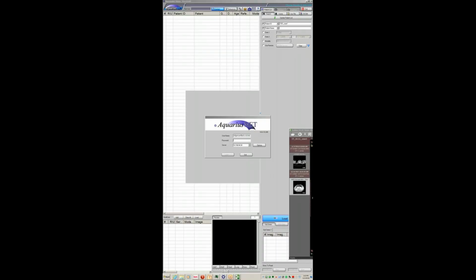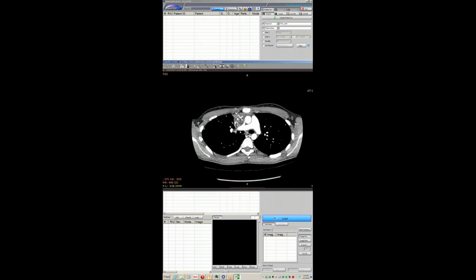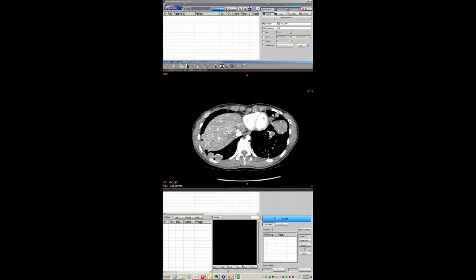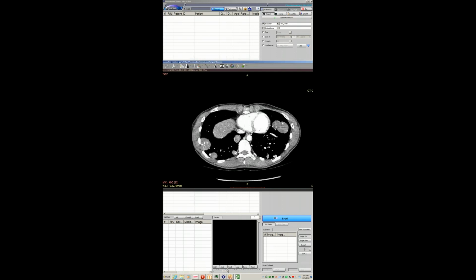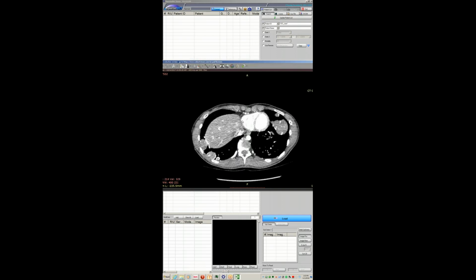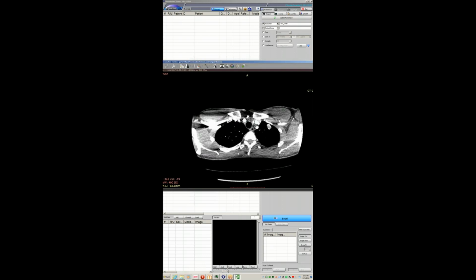So this is that case I think I showed. Maybe I never sent it. I don't know. Sometimes I don't send my cases. He had this germ cell tumor, mixed teratoma, yolk sac tumor, some mixed tumor that was treated, and he had all these mets that were treated, and the malignant portion was killed, but the benign teratoma portion has remained. And the problem is that these are tumors, they're benign, and they keep growing. So they get big, and they wedge them out or take them out, but they're all benign teratomas.